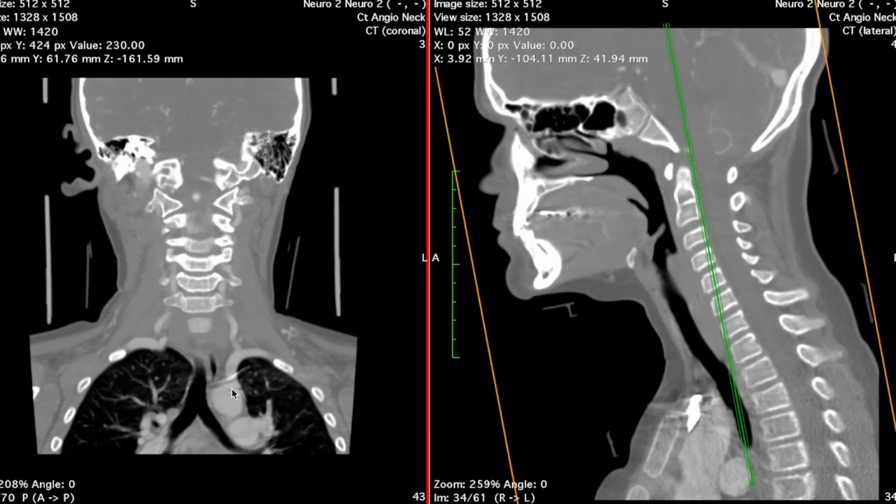All right. And finally, the last branch off the aortic arch. This is the left subclavian artery. And the left subclavian artery also supplies the arm, but there's this branch here on the subclavian artery, and you can see it traversing these transverse foramina in the cervical vertebra. That's the vertebral artery. So the vertebral artery that we talked about earlier comes off of the subclavian arteries.